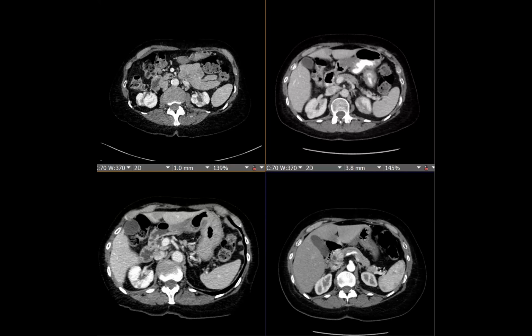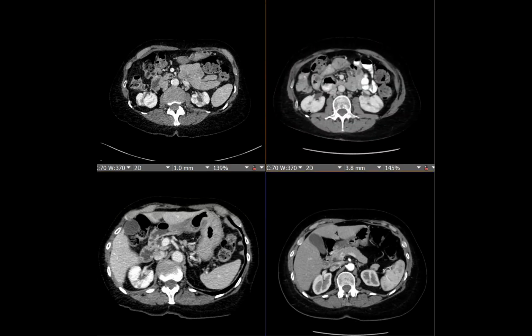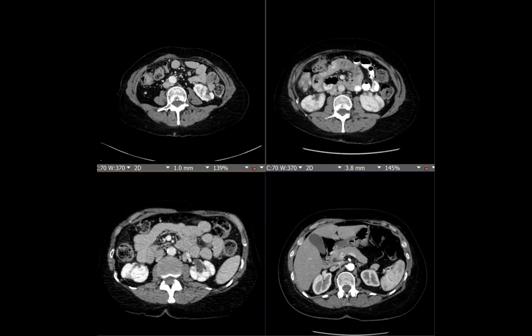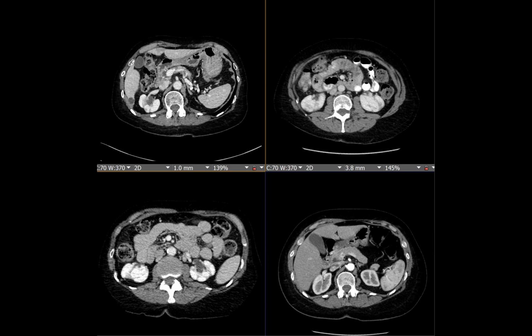And there's also this tubulointerstitial nephritis. On the first exam, the kidneys look pristine, and they're fine. And then you see all these defects that over time develop in the kidneys. So I thought that was a very good example of this entity. Were they on steroids this whole time, or were they being treated for it? They were given steroids, but unfortunately it did progress. And this was over a course of 15 to 18 years. I was told not to give exact dates, but this was over a very long period of time.